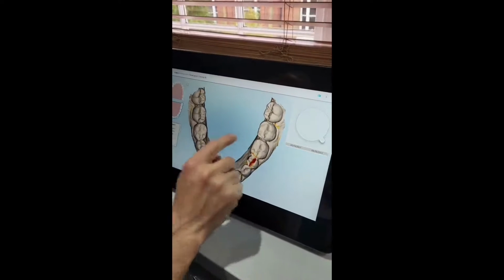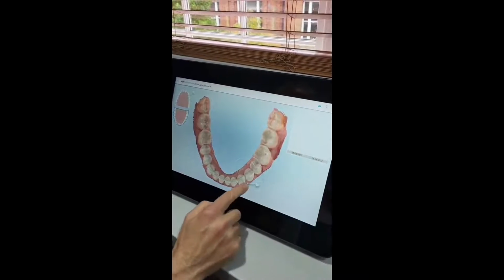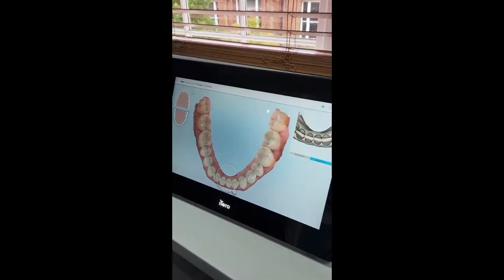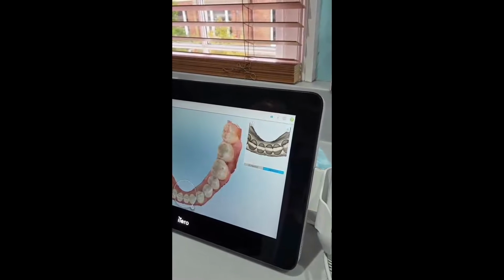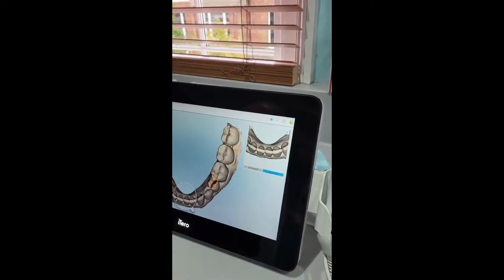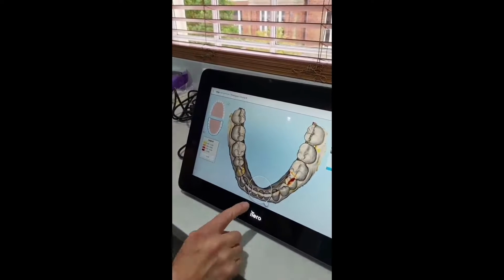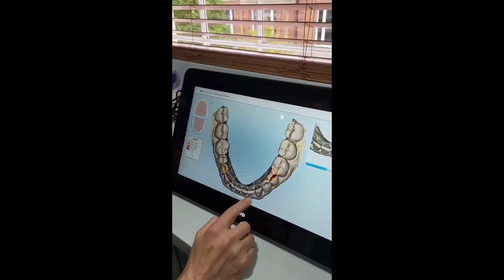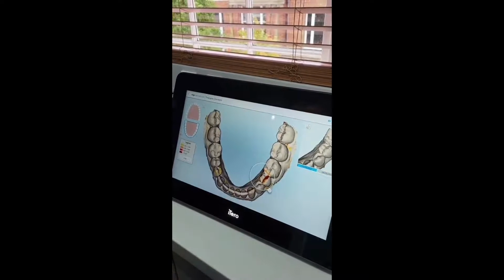And again, you can put it on real life. And you can see the two there. You can also show a color change, you know, how significant that change in position was. There was a slight change there. There was a bigger change there, showing in red.